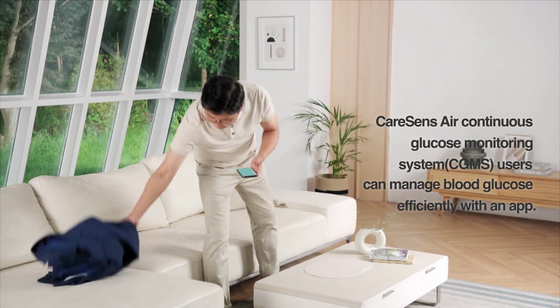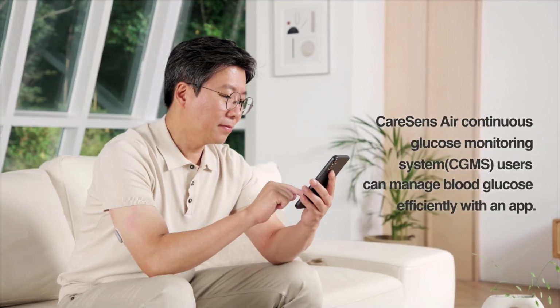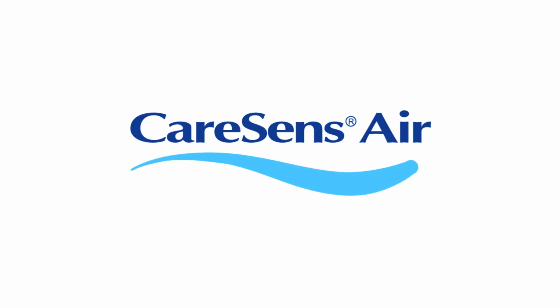CareSens Air Continuous Glucose Monitoring System. Users can manage blood glucose in a systematic way with an app. In this video, you will learn how to use the CareSens Air User app.